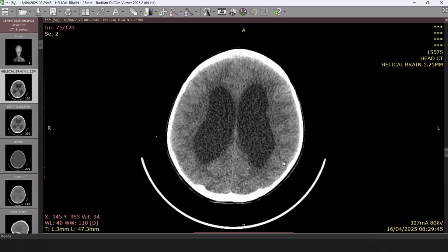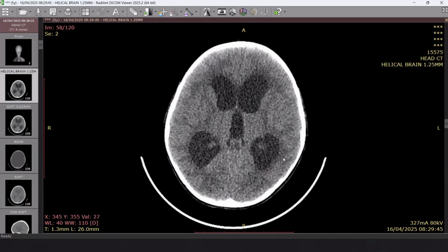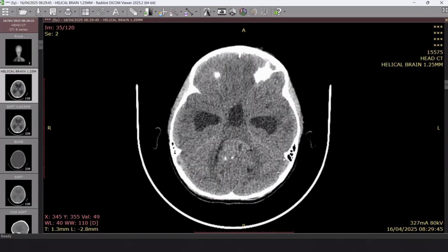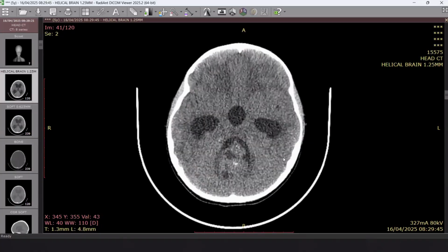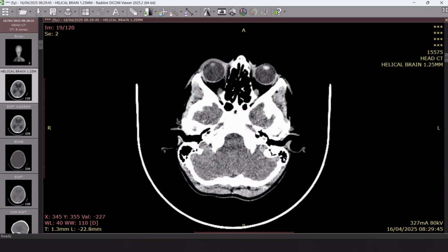We also have significant effacement of the cortical sulci, which means that we have intracranial hypertension. So this one is not passive ventriculomegaly for sure. It is hydrocephalic changes. What else? You can think about the differential diagnosis of the fourth ventricular mass lesion or complication of this mass lesion. Okay. What else regarding the description before going to the differential diagnosis?